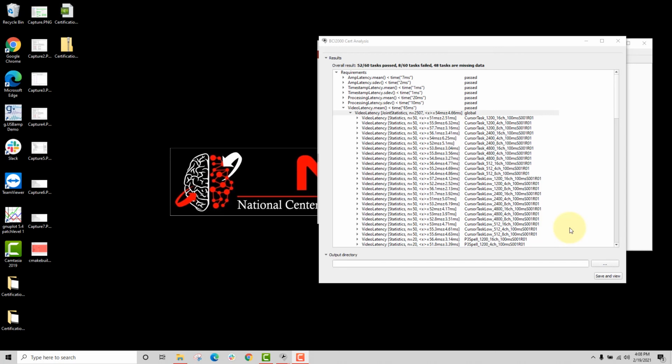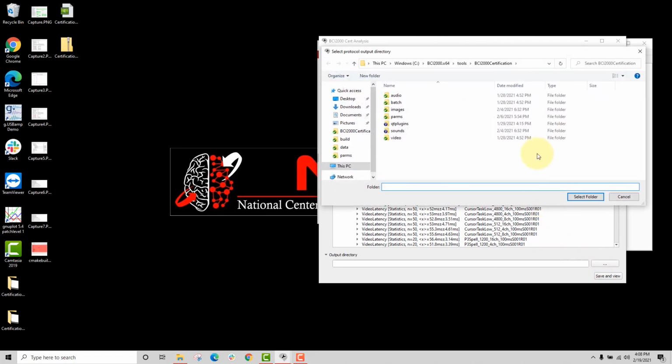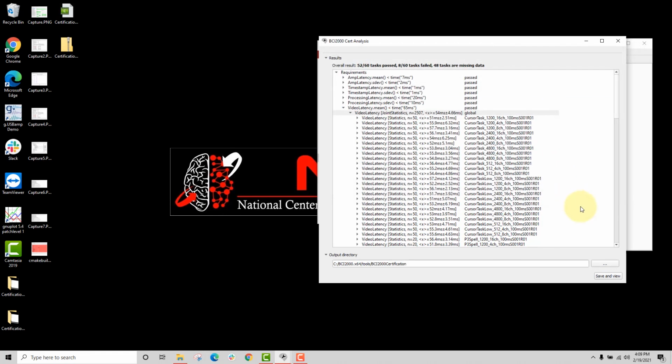So finally, we can save these results. What we'll do is we'll specify an output directory to store these results in. For now, I'll just choose our BCI2000 certification tool directory directly. We'll select this folder, and we can push save and view.